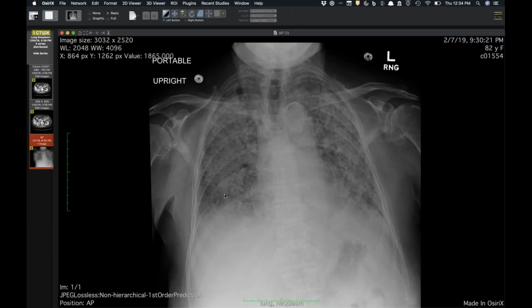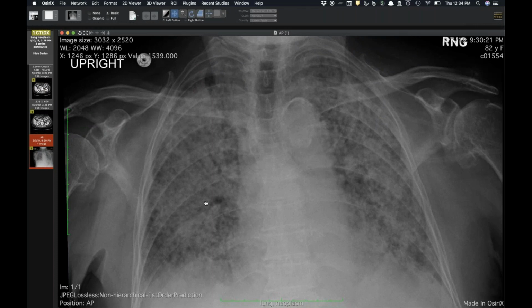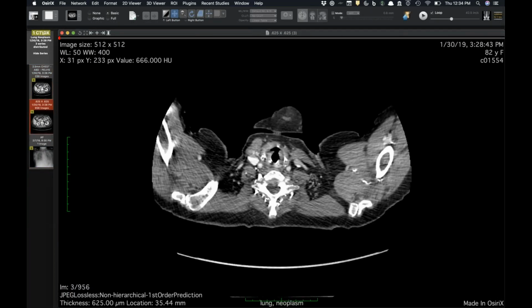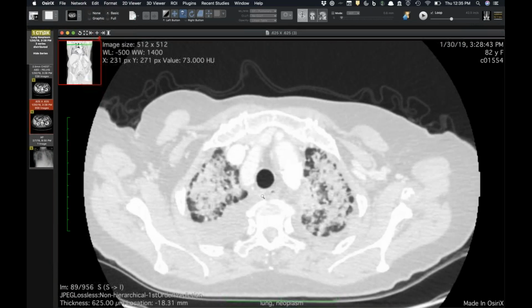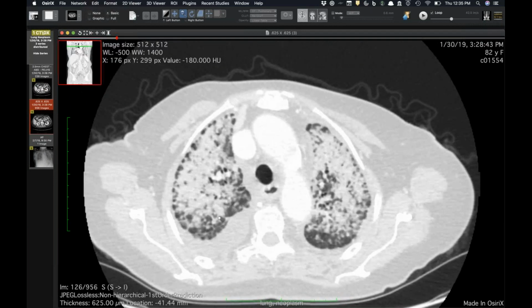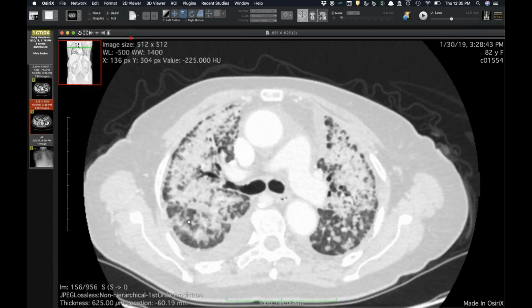And then I want to show this one just because David's been showing a lot of cases of fungal infection. And this is a patient who just came in a couple of weeks ago. 82-year-old, and you can see on her radiograph that she has what looks like diffuse consolidation, when you just see that it's tons and tons of tiny little nodules that are coalescent. And so this is what it looks like on the CT. And keep in mind, with lungs that look like this, she's not intubated. She has small effusions, but she just has sheets and sheets of nodules that just coalesce into almost diffuse consolidation.